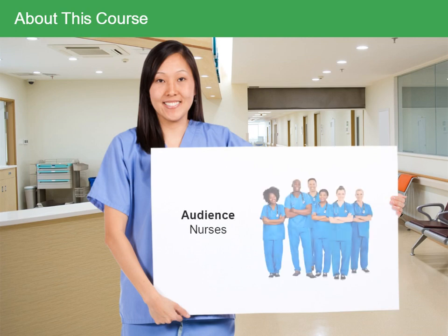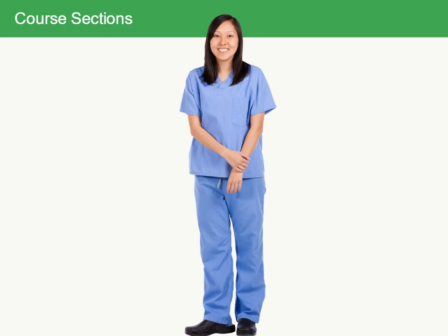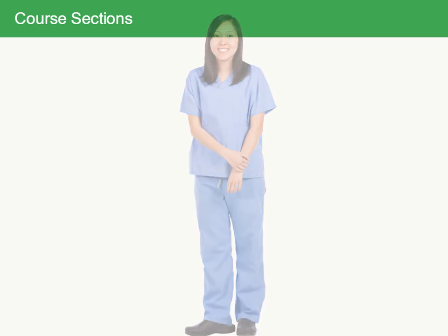This course is intended for nurses like you who will be using AnywhereRN to remove, return, and waste medications for their patients. I know your time is important, so let's jump right in and start using AnywhereRN. The rest of this course is divided into 3 distinct sections.